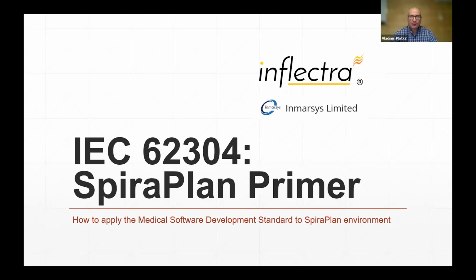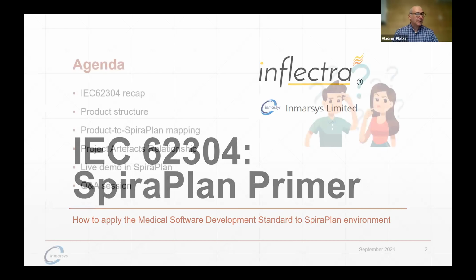So I just collectively call it Spira. So everything we're going to be talking about today is applicable to the entire product line. Here I'm going to be showing SpiraPlan, but generally it's all the same.